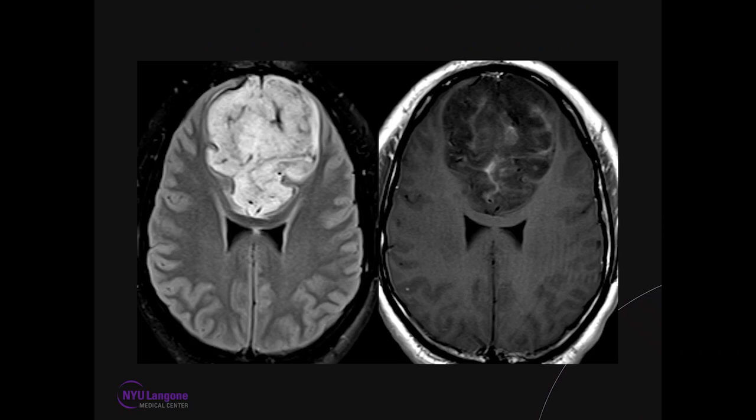Now, moving on to the IDH mutated gliomas, this is an example over here, a well-defined bifrontal lobe large mass without any significant edema. But the more important thing is that this is a younger patient, 28-year-old male, clinically intact. All this patient has is headaches, so there is no real neurological deficit.